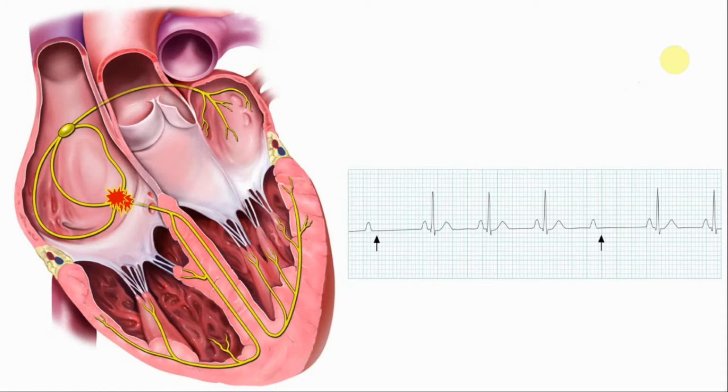Thank you. No worries. So there are some subtle differences, and we'll show you a little table between Mobitz type 1 and Mobitz type 2. But if you can understand those little animations, you will have some idea of what happens in the underlying pathology: the SA node is generating cardiac impulses, but not all of them are transmitted through the AV node and bundle of His, and that is second degree heart block. Now let's show you some 12 lead ECGs and some rhythm strips, and Becky is going to interpret them in a very systematic way so that we don't miss anything.